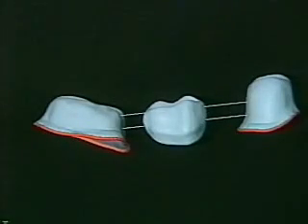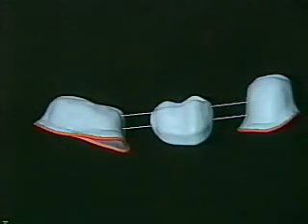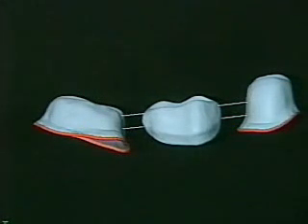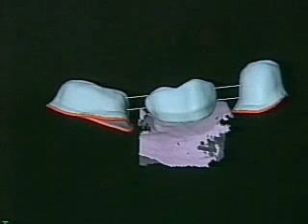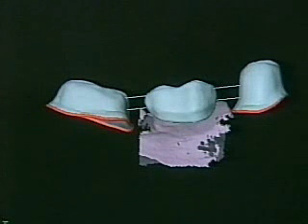Now the cores, gingival section and byte record are present as individual digital image sections. The computer image can be freely moved in the space so as to control construction from all sides. The data for the connecting part is already prefabricated and can be retrieved from an image library. The pontic is freely scalable, which means it can be enlarged, widened, made higher, in short, adapted to the available space and required shape without restriction.